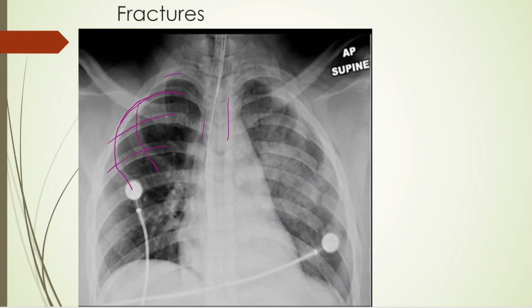And these here look good. Clavicle on this side looks good. Clavicle here looks good. This is the first rib up here. Looks fine. Second rib looks good. Some people say, oh, that looks like a fracture, but that's actually the anterior portion of this rib overlapping, so it tends to make that look like a fracture, but it's not.